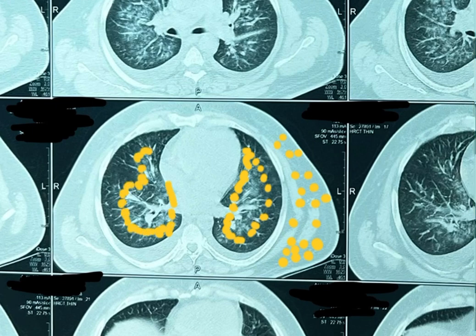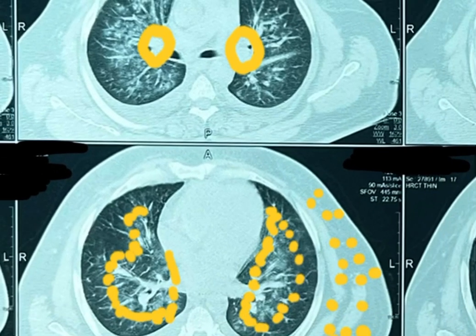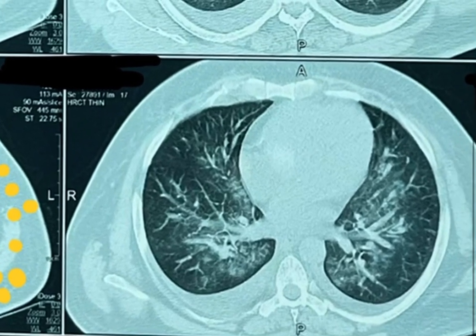So as we know, this is the pulmonary trunk, this is the pulmonary artery and pulmonary trunk, and this is the pulmonary vasculature. Basically, this is the way through which the pulmonary vasculature goes. The pulmonary arteries, pulmonary veins, and bronchi, they all grow from this side. So this is all pulmonary bundle. So this is pulmonary vasculature, and whatever involvement is there, it is all around this area only.